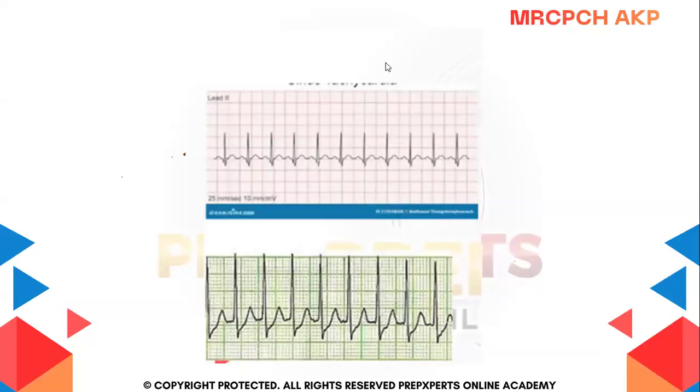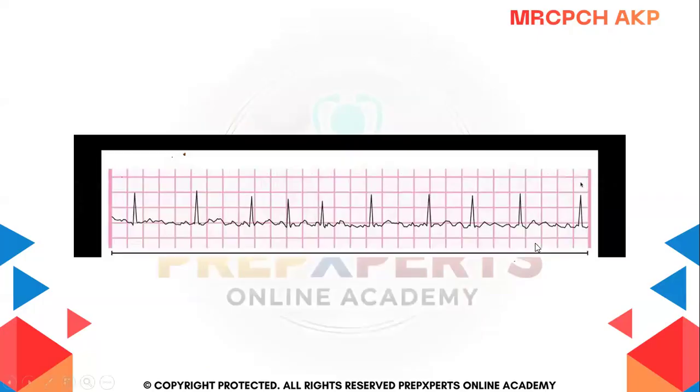150. Okay, let's see. Yes, you guys are right. Excellent. So we'll move further because these are very little things about ECG. Okay, can anybody tell me, suppose it's a 6-second strip, and now tell me about the rhythm and the rate.